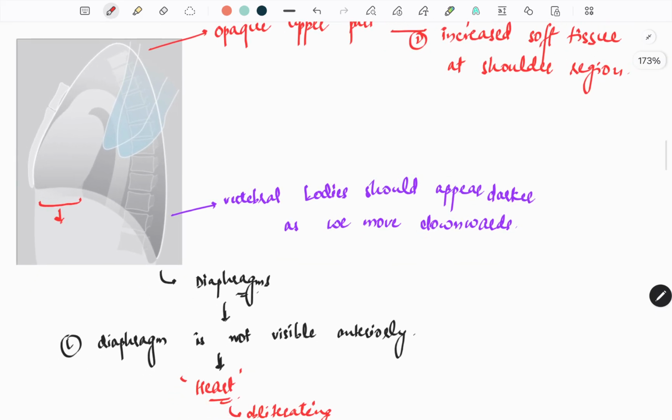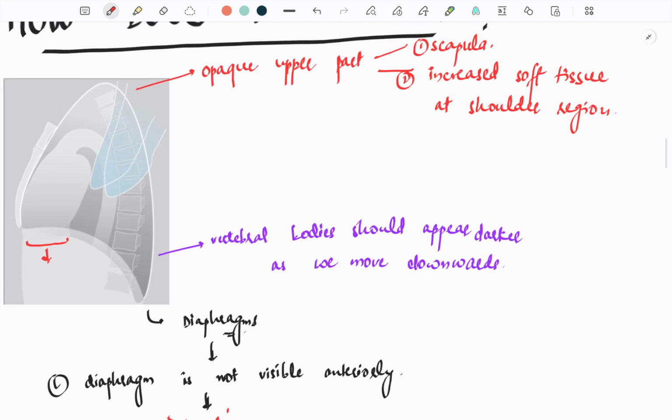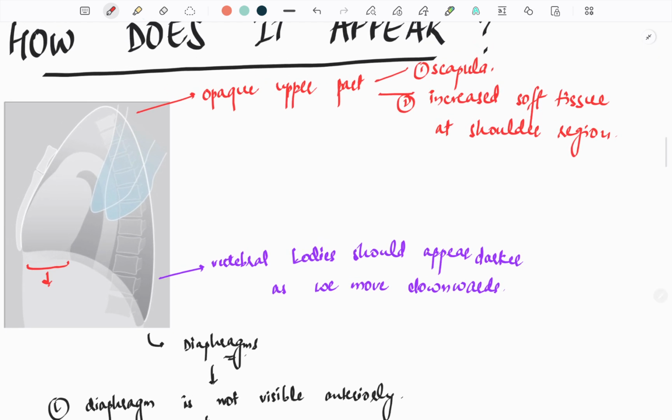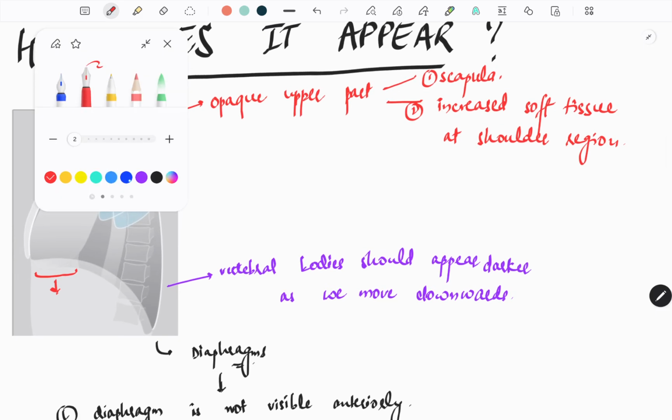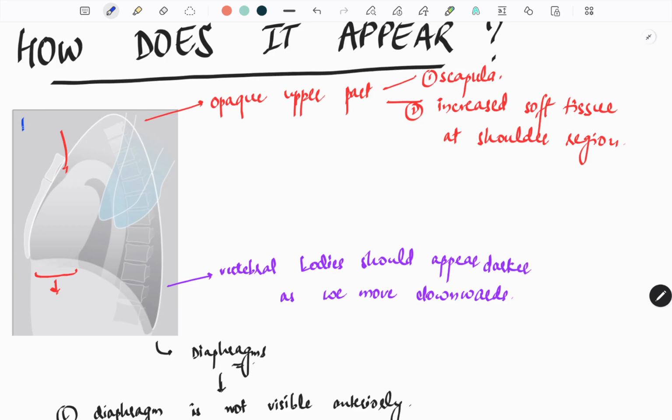Okay? Then retrosternal lucency, we should look for.